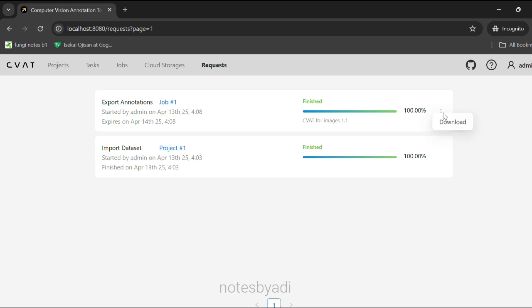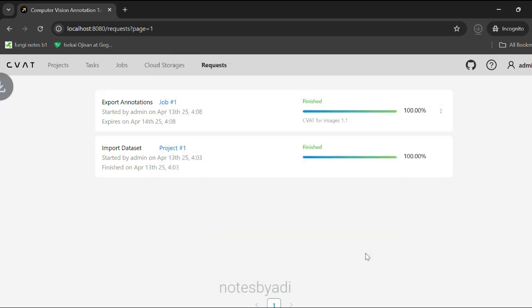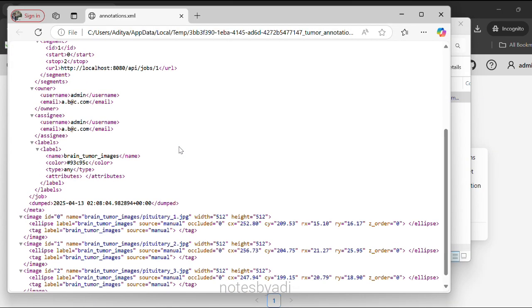It is understood, of course, that when your downstream tasks look at this kind of a file, then the coordinates of the labels will need to be parsed explicitly by the code.